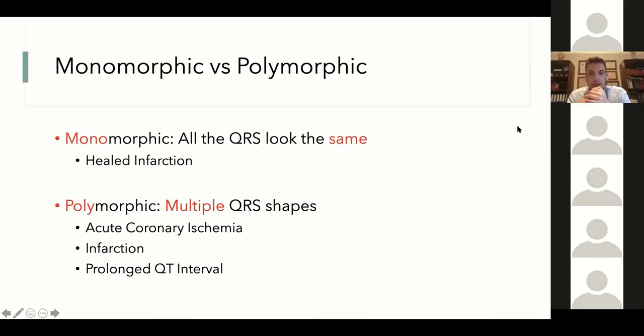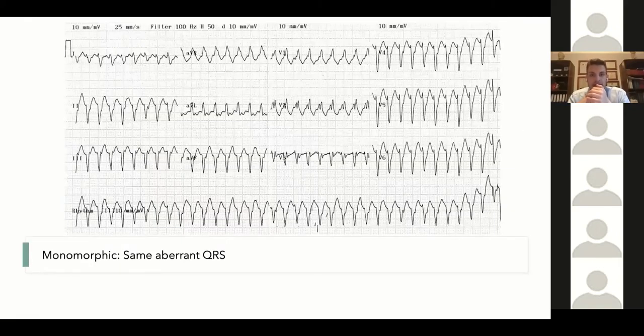Now, let's go. Does anybody want to go through this ECG with me? Feel free to pick up the mic. Anyone? Hi, anyone? No?